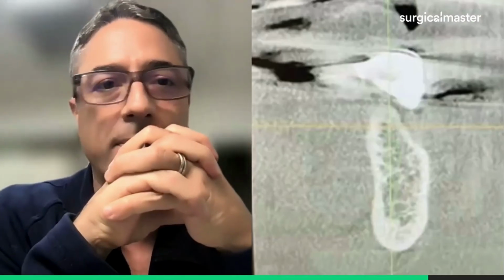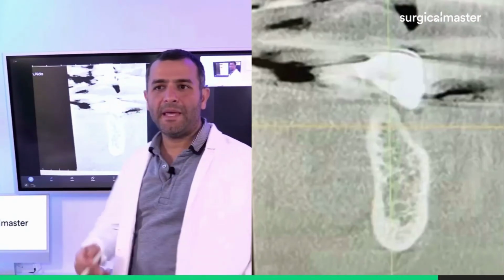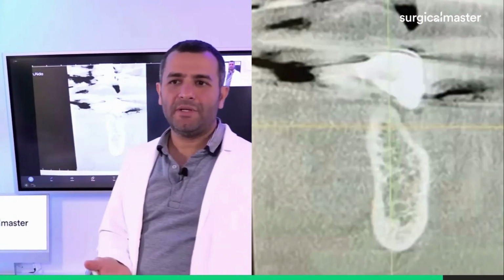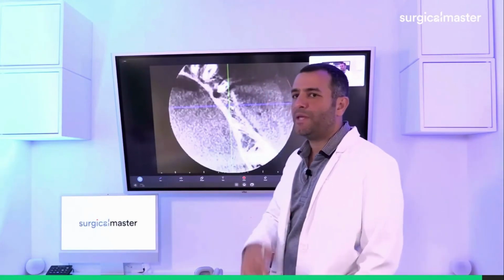I feel like I have a lot of information, but I need to blend it all, and it all can be blended in the software. Okay. So before you give the doctor recommendations, let's get more slices, get a wax up of where the ideal position is, and then scan throughout the ridge area to see, is there one place that's better to put an implant than another place, before you make a decision from the limited information you currently have. Right. Cool. Okay, that's a great case. So I think to be continued.